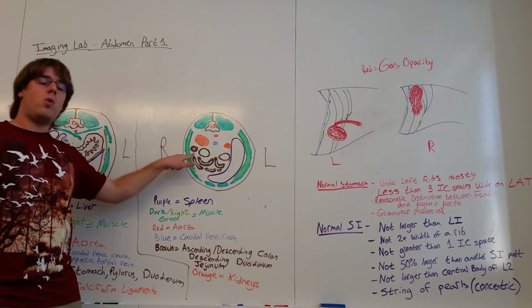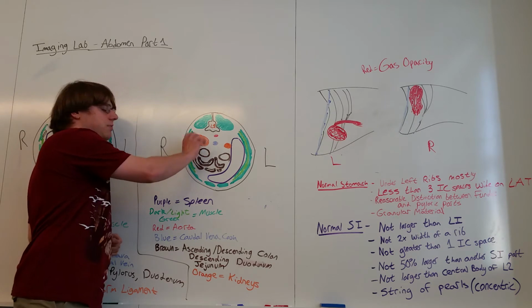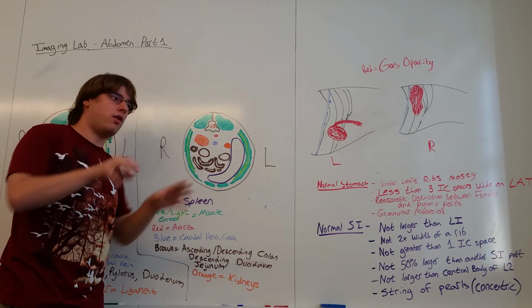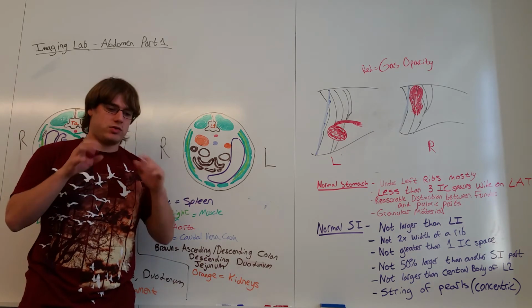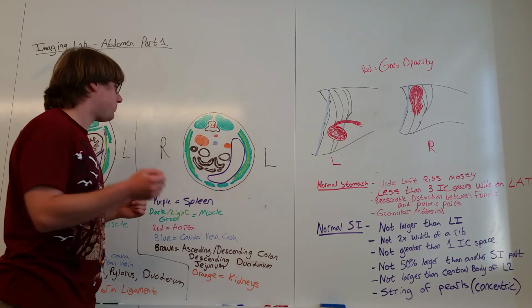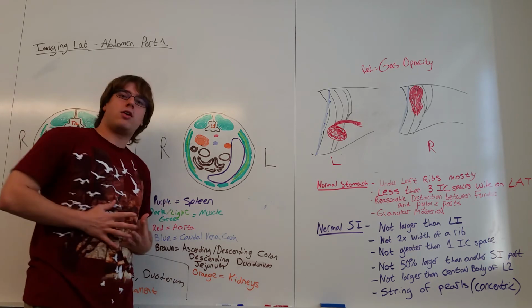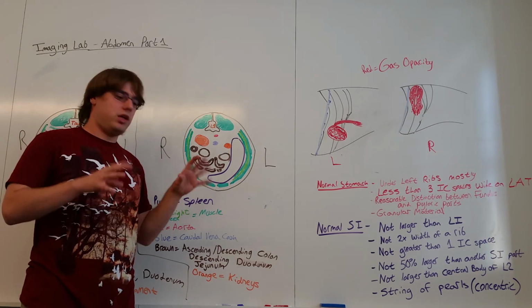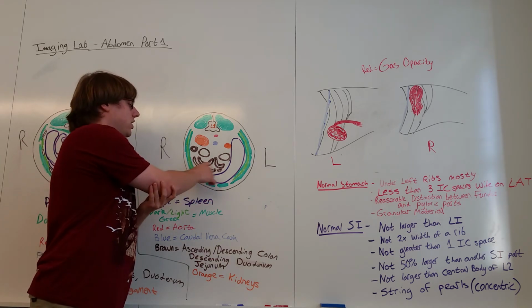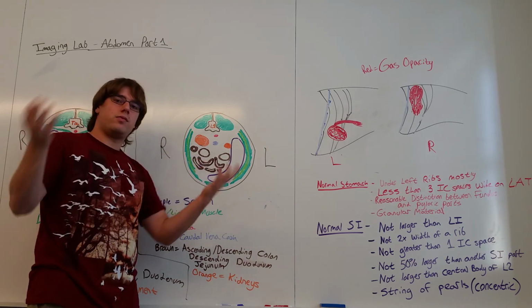And as I said before, we have our descending duodenum, and you can recognize that because, again, it appears to have that thicker wall. And that's really just the lumen that projects throughout the small intestine. That is part and parcel to the absorption of the small intestine. And of course, all our crazy little macaronis going on in the center of the gut, those are going to be our jejunum, the middle part of our small intestine. And you'll see most of them getting transected or sagittally cut because they run all over the place.